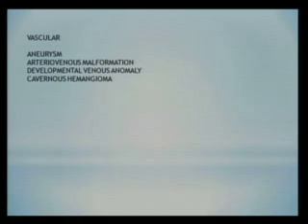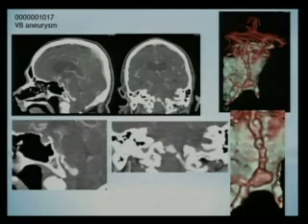Vascular abnormalities, we'll discuss briefly aneurysm, AV malformation, developmental venous anomaly, and cavernous hemangioma. This is an aneurysm in a rather unusual location, i.e., where the vertebral arteries come together.